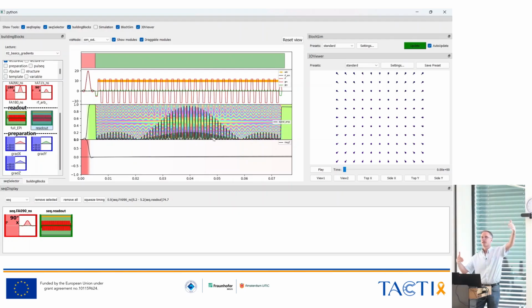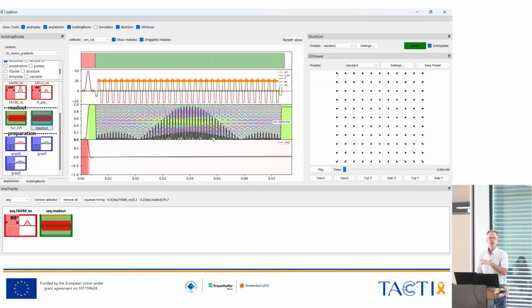There will always be some time, so the simulation is really limited in that regard. You will always get those aliasing artifacts, and you will always be able to get rid of it by adding more spins. But at some point, it's just inefficient for our hands-on simulation. That's why I chose this, and that's why we see this maybe strange-looking artifact.